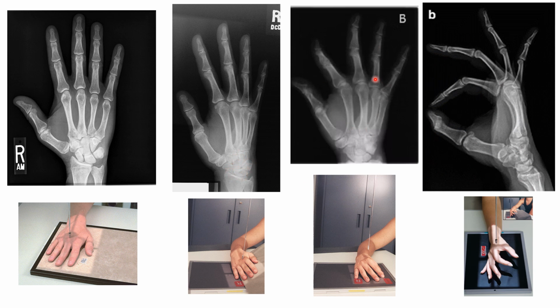Now this image doesn't quite meet our criteria as far as seeing all of the digits superiorly and an inch of the distal forearm inferiorly. We don't see that, so this is not meeting criteria. And also we've clipped that thumb. That's what I was talking about. Be careful about that thumb. Make sure that you're not clipping the distal phalanx of the first digit on the thumb. So this was a good example of some things to watch out for when you're X-raying and also evaluating your images for diagnostic quality before sending to the radiologist.